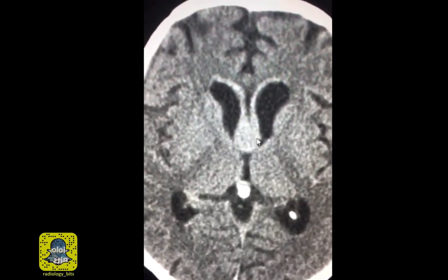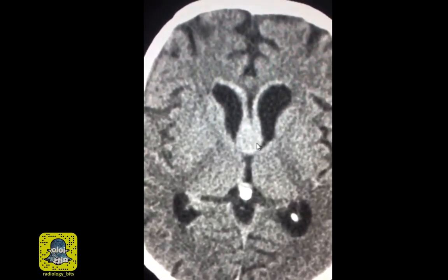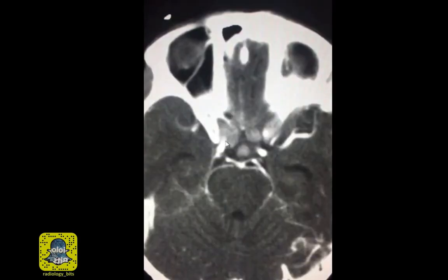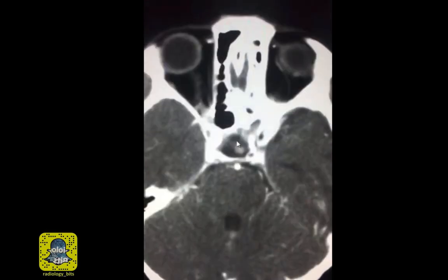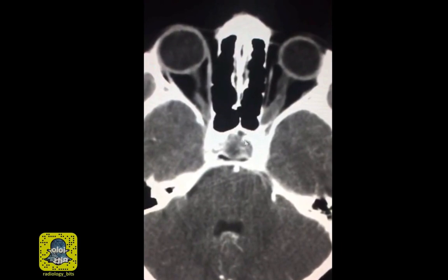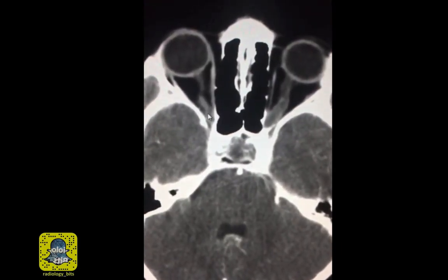From the start, we excluded meningioma, which is an extraaxial lesion. We also excluded glioblastoma since it's not spontaneously hyperdense. We talked quickly about the structures that form the floor of the third ventricle. And we also learned that if you have lesions that involve the optic chiasm, make sure that the optic nerve is not involved as well.